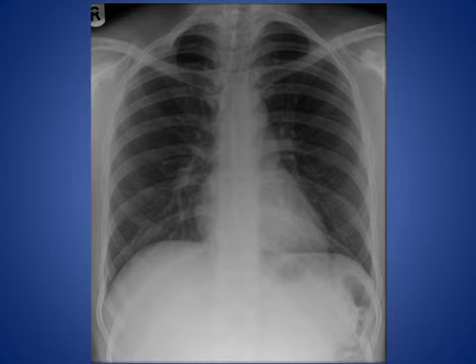10 seconds given to you to answer this. Okay, it is an easy chest X-ray. As we see here, there are bilateral cervical ribs. The right one is larger than the left one, and it is asymmetric. And the rest of the chest X-ray is normal.